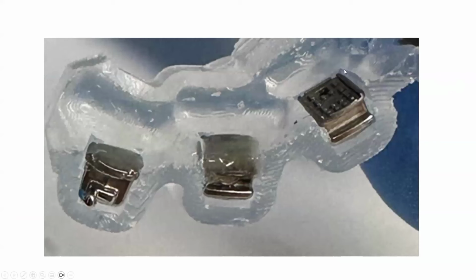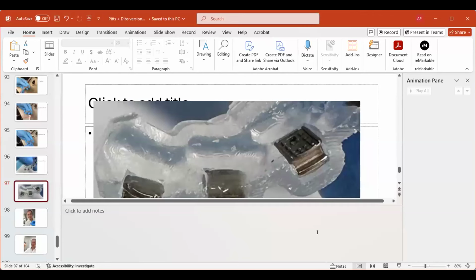Right here you can see that the adhesive is flush with the edge of the DIBS tray. Here you can see one that's not filled, but it's going to need to be filled to this line right here where it becomes flush. By looking at and learning how to read the DIBS tray, they can tell how much adhesive to use. It's a skill they pick up pretty quick overall. Been pretty impressed with that.